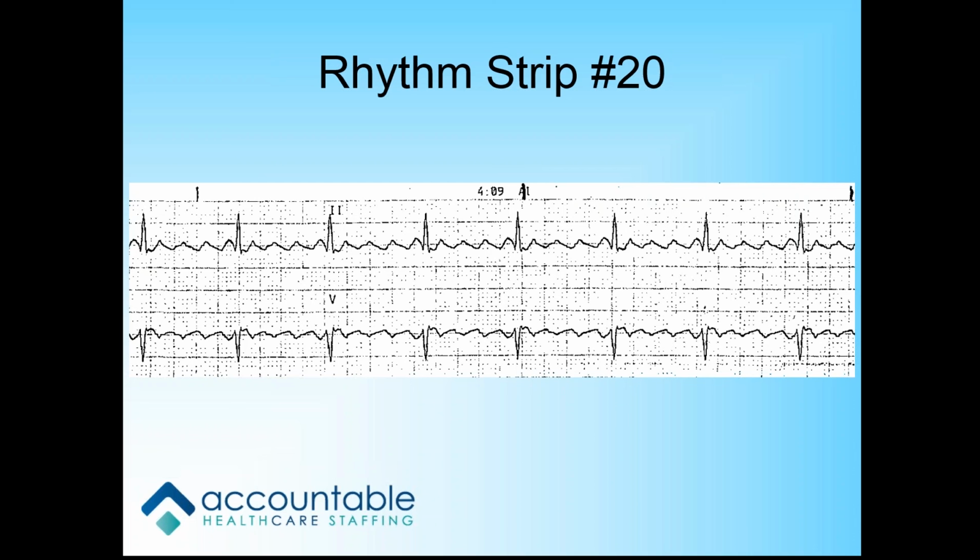Sorry, I didn't talk that one through. Perfect. I mean, it's regular. Your atrial flutter can be irregular, but those are distinct flutter waves, and I believe the rhythm strip that's on the test is very sawtooth like this. Next. So good job. Atrial flutter right off the bat. Thanks. It's a 4-to-1. Next.